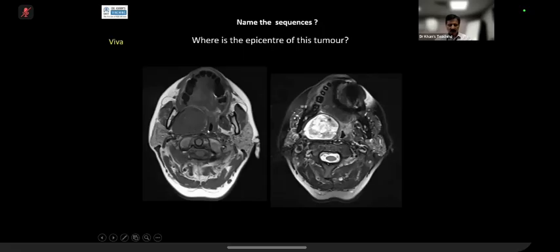Now, if you see here, this is the pharyngeal mucosal space. The mass is also displacing it to the contralateral side. It's not arising from it. Now, deep lobe of parotid, good point. I will take it because you are just seeing a single sequence and you would like to see more sequences before you make up your mind. But it is actually not arising from the deep lobe.